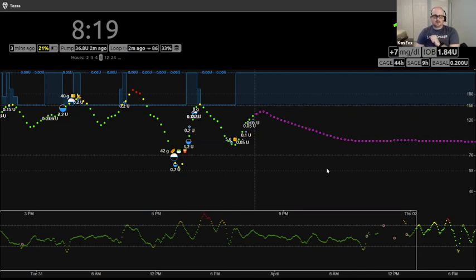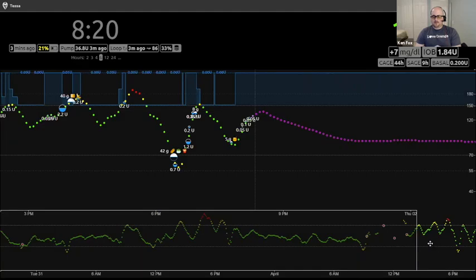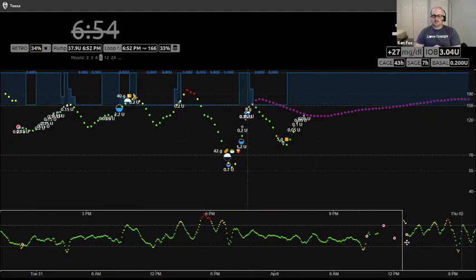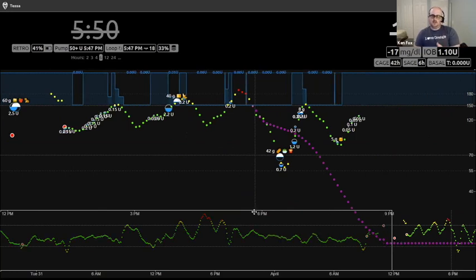Let's go over those, but I realized I should probably do one more thing. So we talked about the mini graph at the bottom, and we have the main graph at the top. If you click or tap with your finger in the Nightscout app or on the website on your phone, you can tap and drag across the bottom and scroll backwards in time. What that will do is kind of important and useful, even if you're not looping. I used to use this without Loop, and it's still a very useful tool.